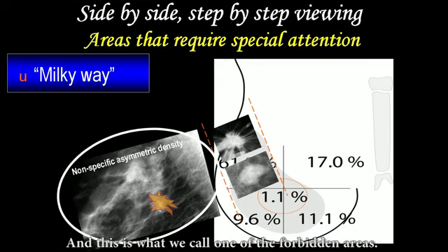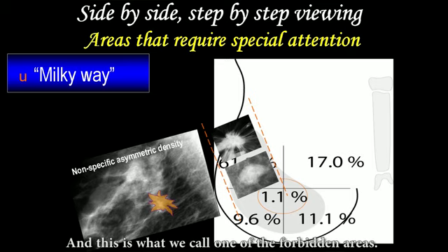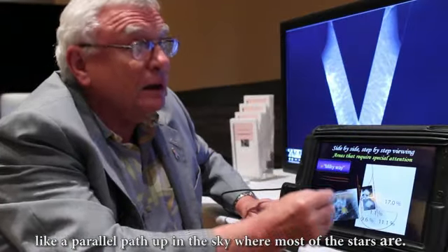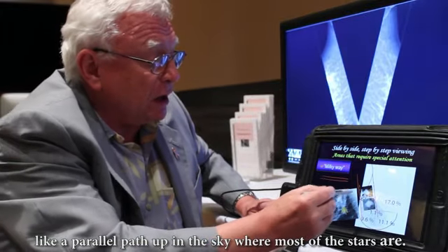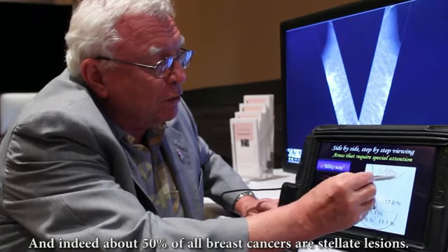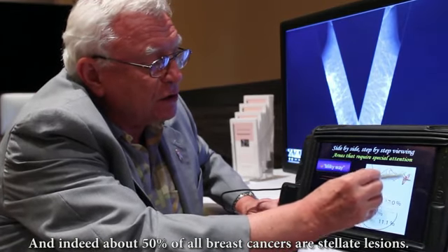And this is what we call one of the forbidden areas. We call it Milky Way because this is a parallel path, like a parallel path up on the sky where most of the stars are. And indeed, about 50% of all breast cancers are stellate lesions.